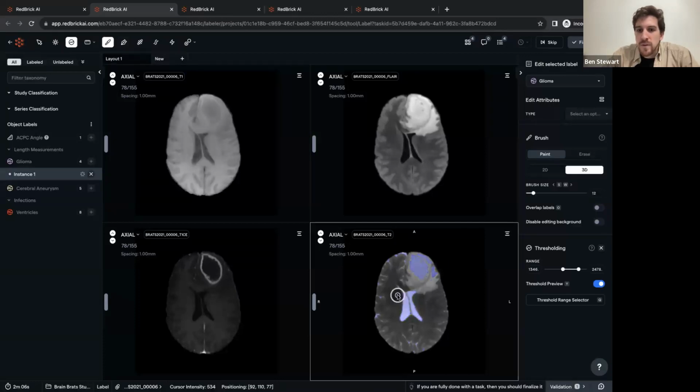I was working with a very small brush size earlier, and annotate within this range. You'll notice that I'm painting outside the lines. However, since thresholding is on, the annotation has only been painted onto the area of the ventricles, and this applies to 3D. So that's a very easy environment setting that you can configure as a labeler, or you can ask your admin to pre-configure it for you, and that will help with keeping the accuracy of your labels in check.